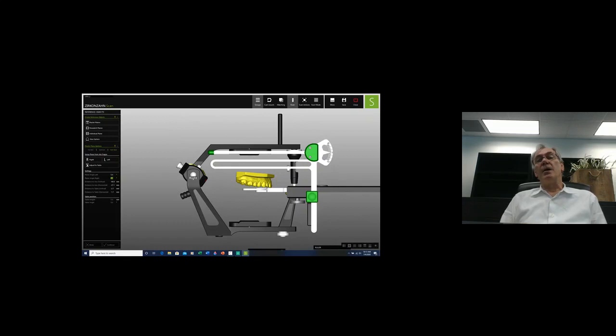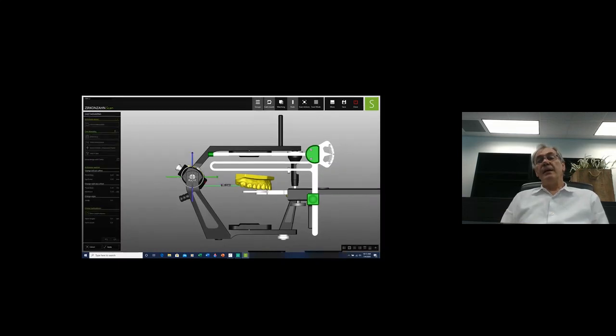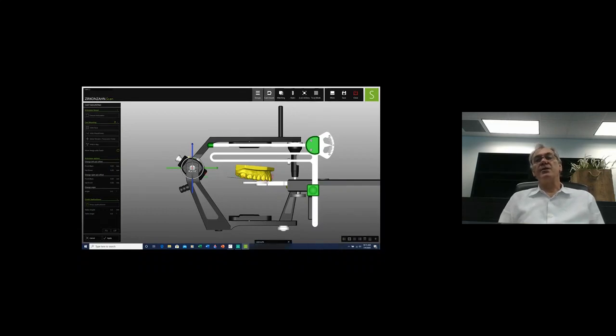We placed the model within the articulator by utilizing the plane finder, and we determined the distance of our reference point, which is our first molar, to the hinge axis. In the specific PS1 articulator, it's 90 millimeters, and we used the ruler to find this measurement and the pitch of the actual upper model.